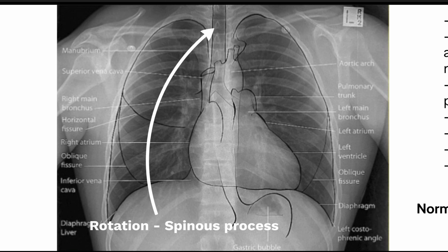Now on the screen you have a basic x-ray. We've highlighted everything so you know the basic anatomy. Let's start off with the trachea here, and behind the trachea we can see the vertebral bodies. Inside the vertebral bodies you can see little white circles, which represent the spinous processes. It's important to check the vertebral bodies. Usually you should count the number of vertebral bodies up to the point of the clavicle, and usually a solid number would be number 4.